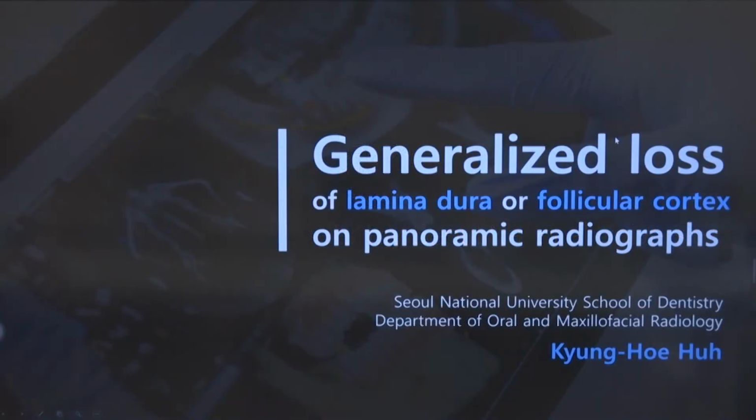The topic of my presentation today is generalized loss of lamina dura or follicular cortex on panoramic radiographs. In this presentation, I want to share with you several interesting cases showing generalized loss of lamina dura and/or follicular cortex of tooth germs on panoramic radiographs and show what that means.